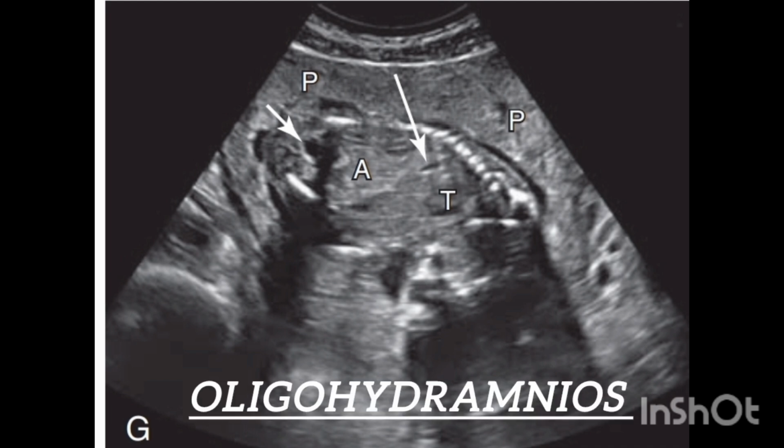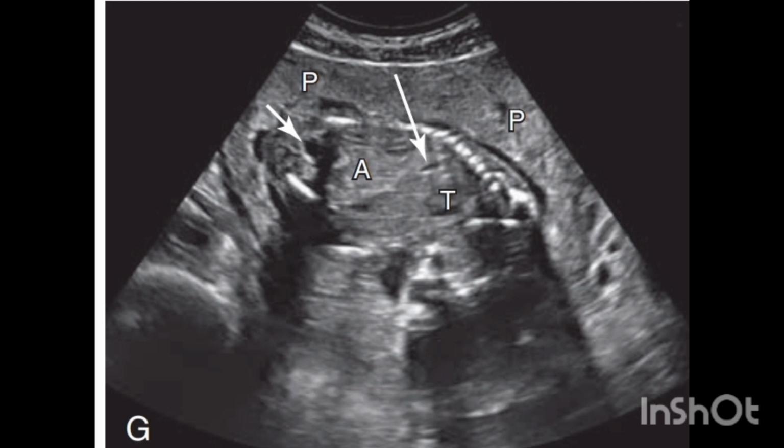In this example, you can see only a small pocket of fluid is present and the stomach is not visualized as there is almost no fluid for swallowing. So this sums up my video.